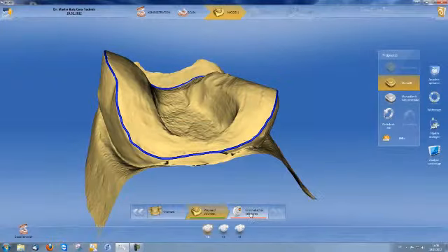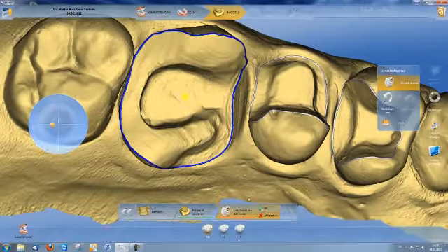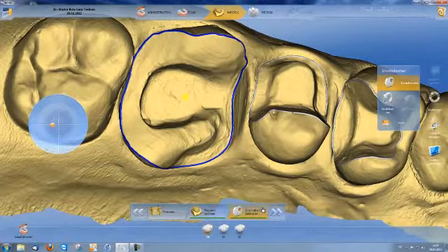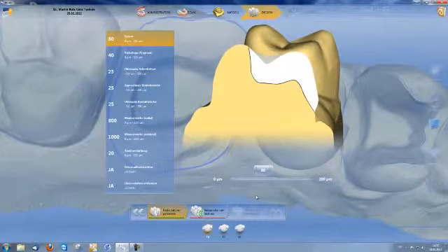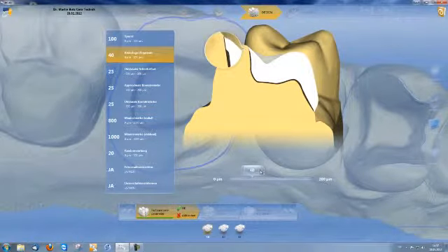Once this has been done for all 3 restorations, I then go to my parameter mode. For this, I click on Next. The spacer and the adhesive gap determine the space with respect to the preparation. Occlusal offset for the occlusal contact strengths, proximal contact strengths.